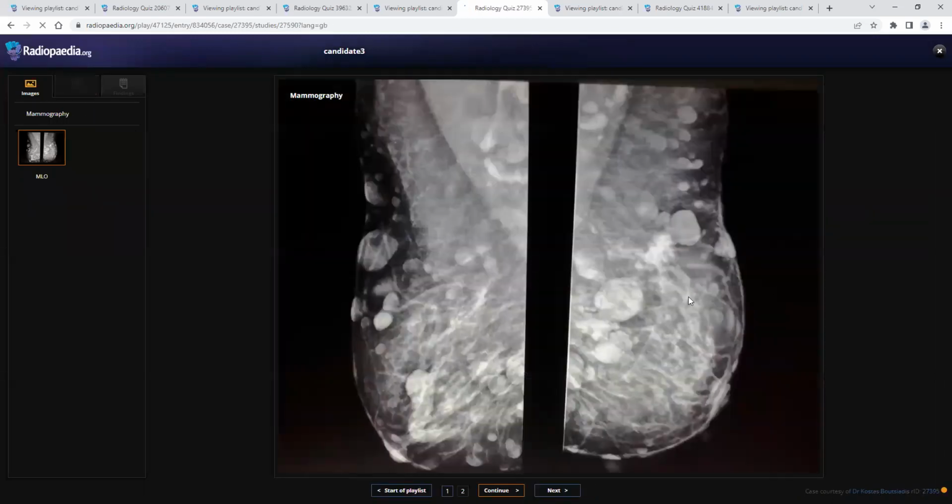And again, this is a good case with carcinoma in a neurofibromatosis patient. And one more thing I forgot, you didn't ask for the CC view. Yeah, that's the main thing. You cannot arrive at the diagnosis in one film, one set of images, and you should always ask for both the views. That's the main criteria.